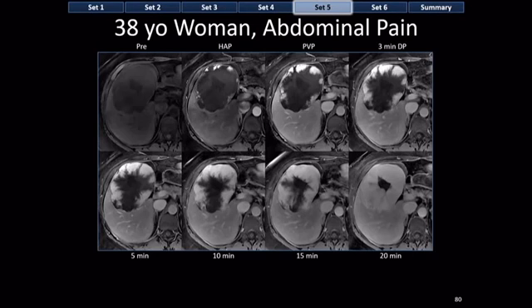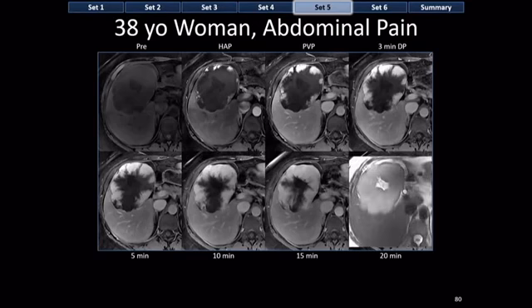And you can prove that by looking at a T2 weighted image. And when you look at the T2 weighted image, you can see that the center of that hemangioma is super bright. It's liquid bright. So what's inside this hemangioma is liquid, not a central scar. So anyway, please don't talk about central scars in hemangiomas. Hemangiomas don't have central scars. Hemangiomas might have areas of cystic change.